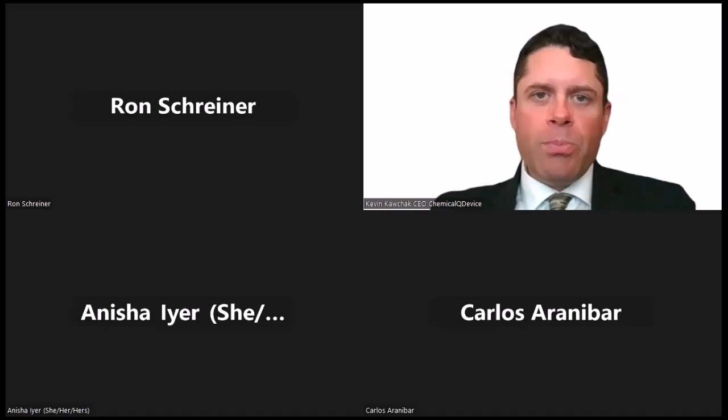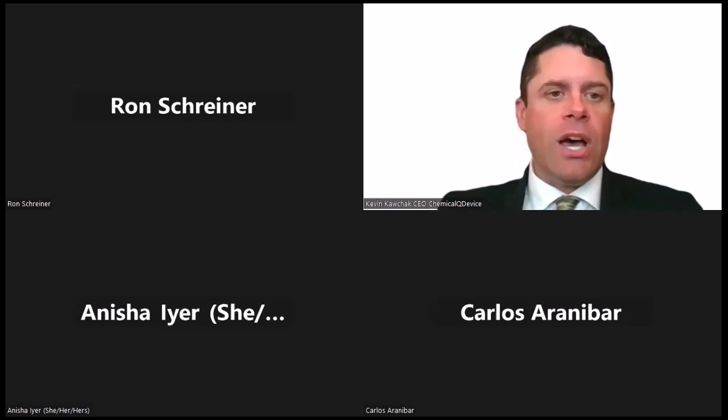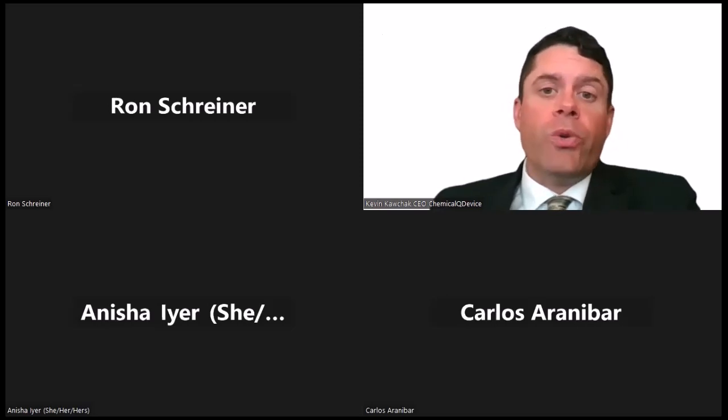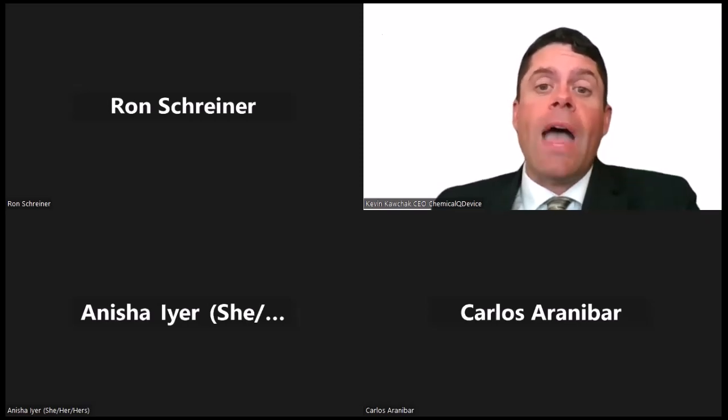If you missed part of this, there were a couple of demos: inserting brain image data sets into a convolutional neural net, and still troubleshooting the training aspect. If you have machine learning, you train, and also doing a circuit in Qiskit, then transposing it, and doing teleportation algorithm modifications to the visualization of those.